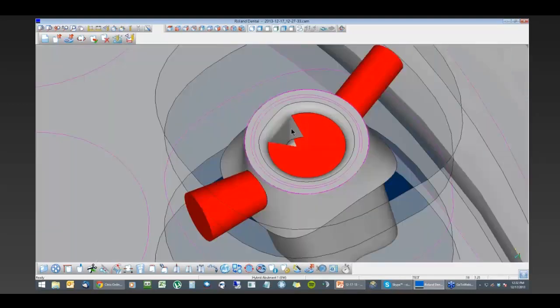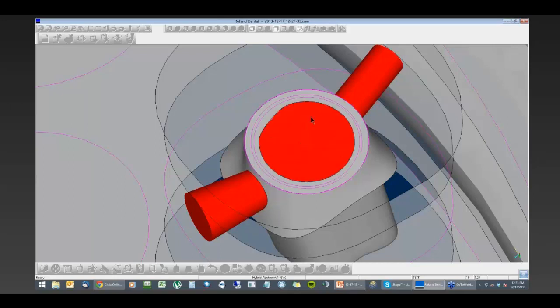So what I want to do is, down here at the bottom, there's a holes closing option that I want to click on. When I click on that, what you're looking for is a change in the contour of the surface. So if it's an abrupt change, it's going to be easier, and you can see that by this black line that's kind of going around the bottom of the abutment. I'll simply click on that, and we can see that the hole's closed for us.